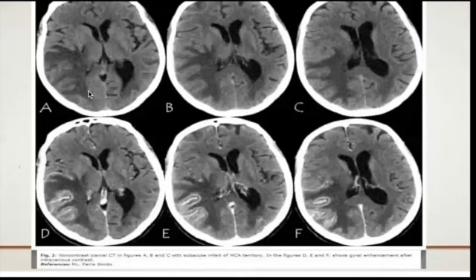Now we're looking at the images A, B, and C. We're looking here at a subacute infarct. Now remember, a subacute infarct is darker in color and it's well defined. We said it's subacute because you can easily identify the borders that you're looking at.